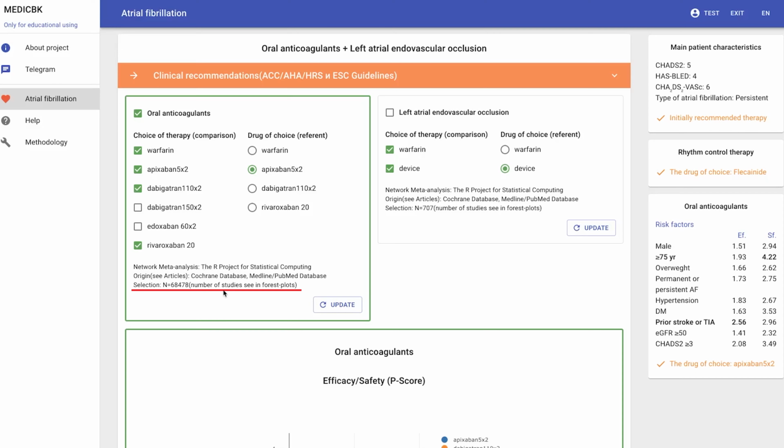As a result of all this, a different selection sample is shown by the system. On the right-hand side of the table, it can now be seen that the rate ratios for the anticoagulants group have changed, reflecting the exclusion of the previously mentioned drugs.